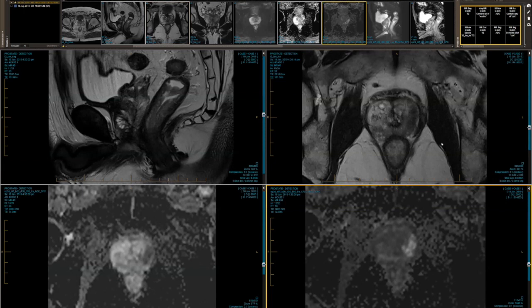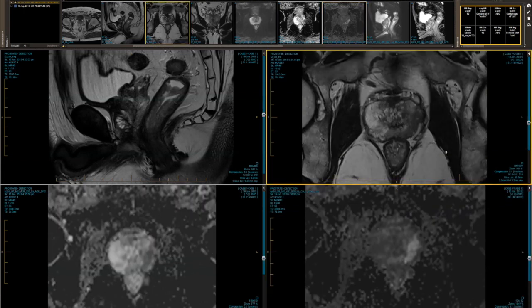The prostate volume here is 30 cc, and I've got that lesion measured over 2.7 centimeters. So I've called that a PI-RADS 5 lesion, dark on the ADC, bright on the high B value diffusion imaging. It abuts the capsule over about 2 centimeters, and there is some capsular irregularity in the left mid prostate, which is suspicious for extracapsular extension. We hardly ever see an extracapsular mass, so it's only in very advanced cancer.